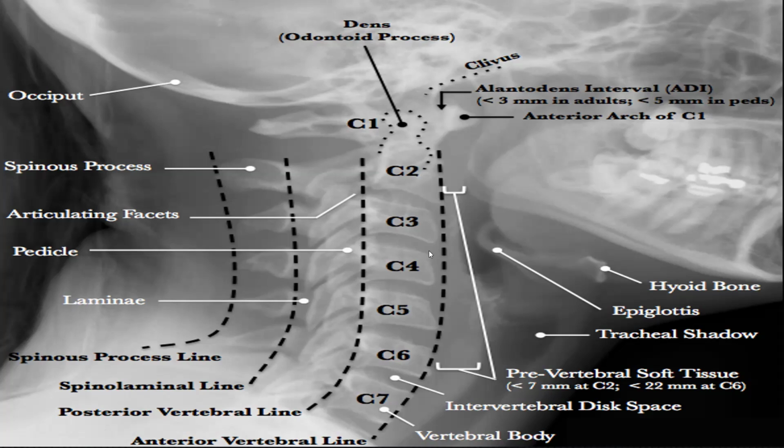In the vertebrae, we can also find an odontoid fracture. Is it vertical or horizontal? Horizontal. So this one is vertical, this one horizontal. Both of them are in C2, right? Yes, sir. Hangman fracture and dens fracture. Okay, what else?